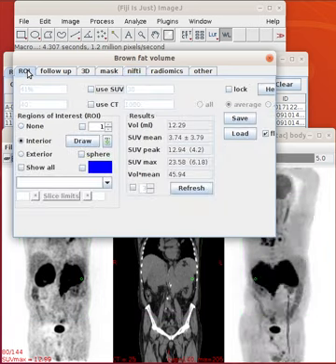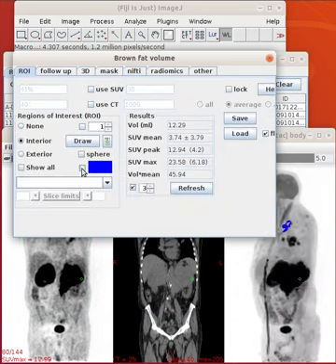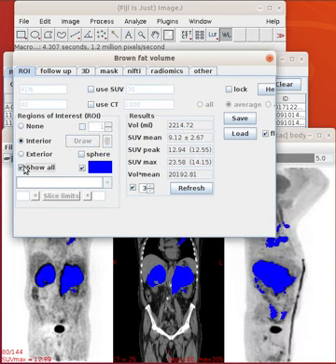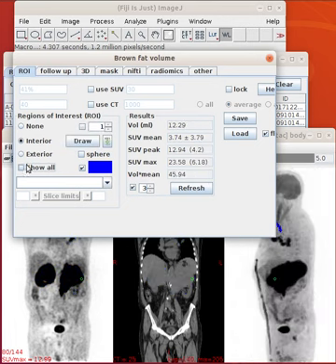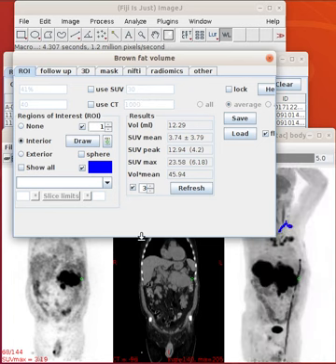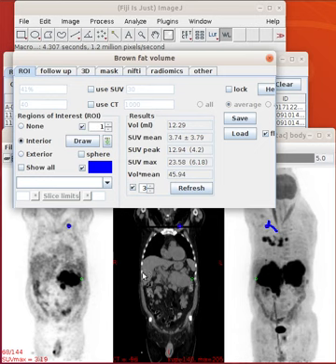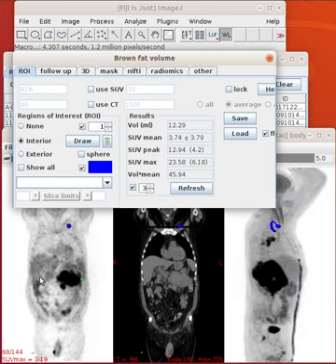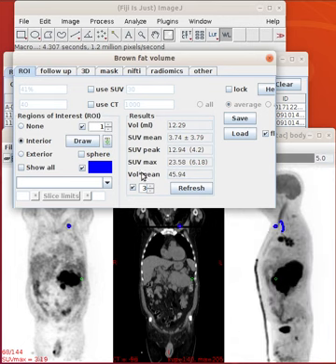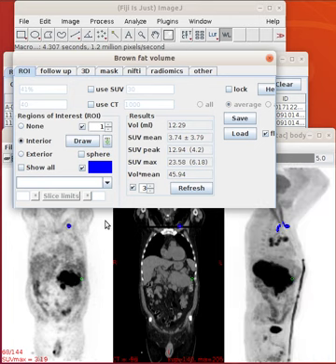So I go back to the region of interest section. I'll ask to see what it's found, the blue dots. I'll ask to see them in different colors. If I want to see all the colors at once, I can, but I want to go through them one by one. Now here, I'm interested in the liver and this other organ, because I've got many seed regions in the liver and many seed regions here.